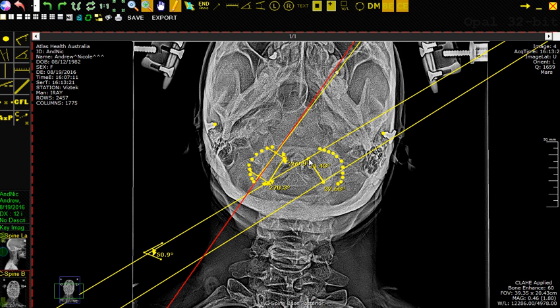Then what I need to do is annotate the other side, so anterior 1, anterior 2, posterior 1, and posterior 2. And so you can see what these lines do is it's already constructing the midpoint automatically. All I have to do is identify where is my anterior 1, anterior 2, posterior 1, posterior 2, and it creates this line. And again, the only reason I have to even do this is because I have to identify using that horizontal orthogonal angle or doing manually a 90-degree measurement like this.